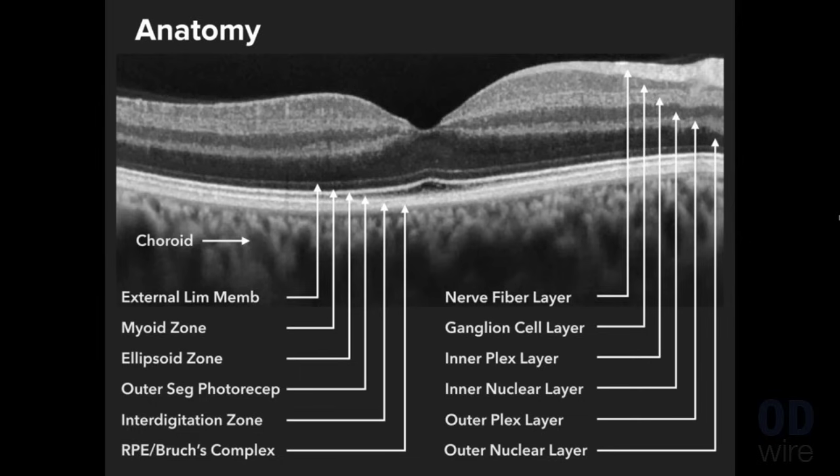and use those patterns to actually determine the diagnosis. In fact, looking at an OCT, there's probably 2 critical layers for most interpretation skills, and those are the ellipsoid zone and the RPE or Bruch's membrane complex. And if you can effectively use those 2 or find those 2 aspects of the OCT, then you're going to go a long way in being able to interpret it.